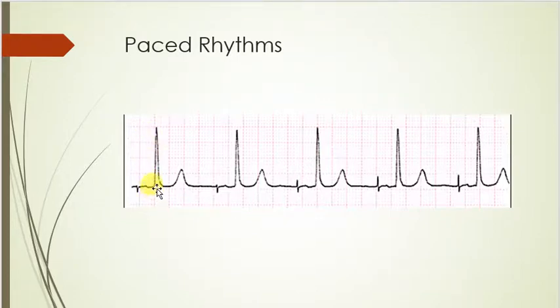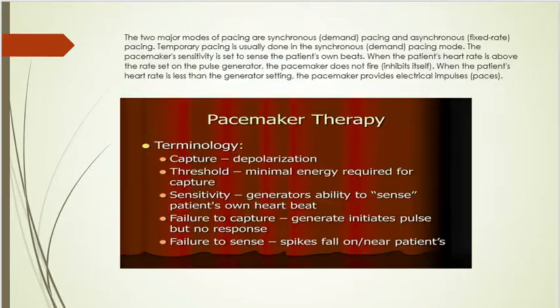And so you see here you have a spike, and that is initiating that, it's sending an impulse just like your node would to the atria to say, hey, get going. So you'll see this little thing here, like a little stroke. That's where the pacemaker is sending the impulse.